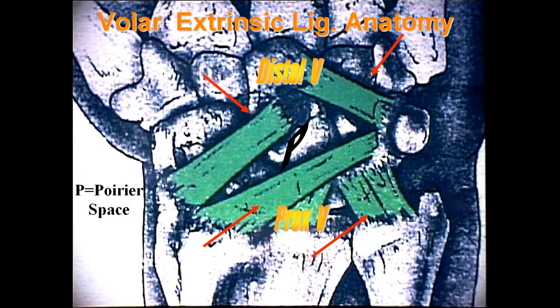What about your vertical V, your inverted V? This is on the volar side. I'm interested in really two major ligaments. As you get more sophisticated, you can learn all these other short, strong ligaments, but the ones that are most interesting are the ones that are weak, that are prone to tear.